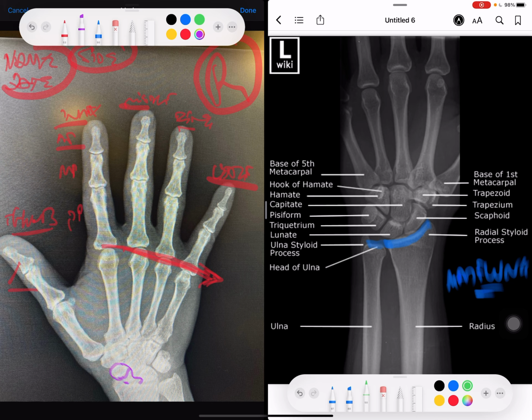Rheumatoid arthritis, and this is huge. So in rheumatoid, like we talked about, there's no spurs because the pannus eats up the cartilage in the joints. So that's one. And plus the fingers will basically skew to one side, like that, it'll skew out. And as you remember, the last thing I'm going to go through is really the bones here.